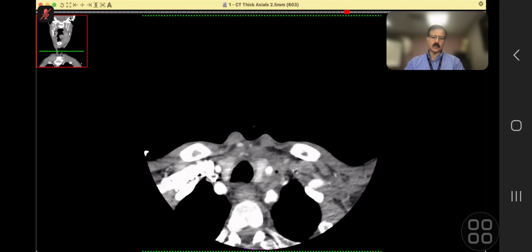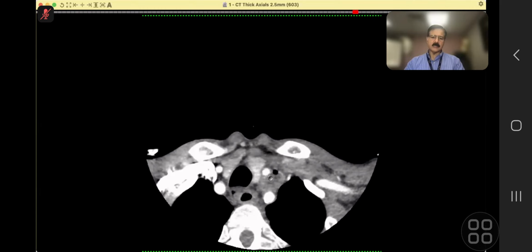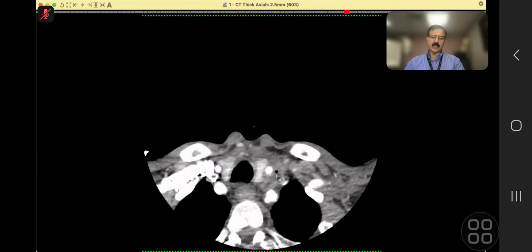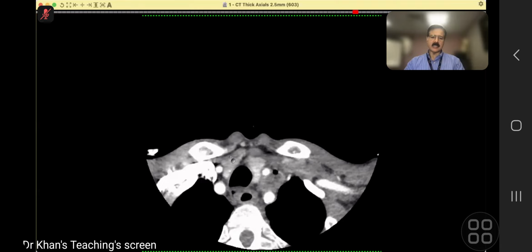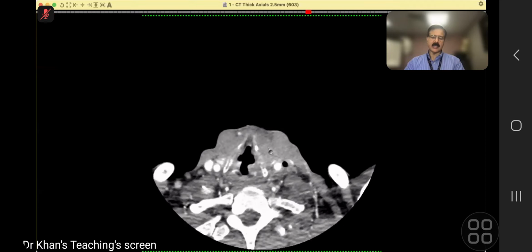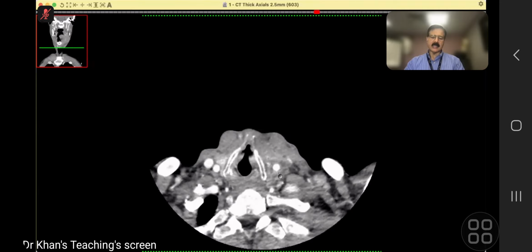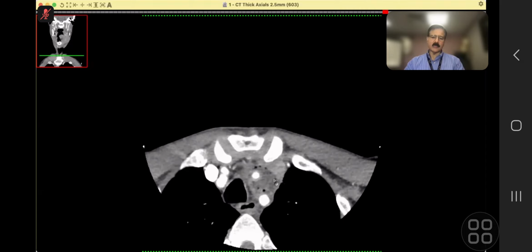So the infection is also involving the visceral space. Here, we have reached the thyroid, and the infection is sitting here. You see this abscess is sitting there. Where is this? This is in the carotid space. And you will agree that the epicenter is not involving the visceral space at this level. Slightly more superiorly, it is involving the visceral, but it is not in this region. And now, as we go down, look at this abscess, and now it makes sense.